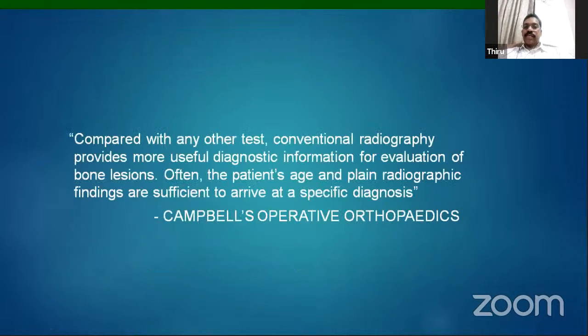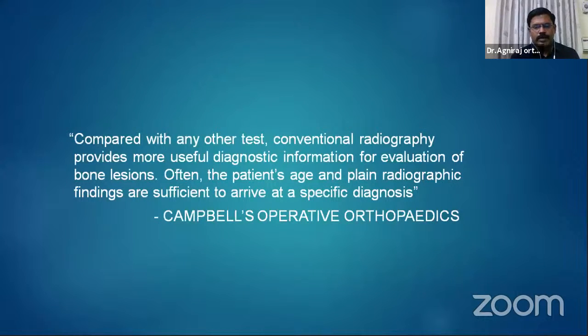These are the lines taken from Campbell's Operative Orthopaedics. Compared with any other test, conventional radiography provides more useful diagnostic information for evaluation of bone lesions. Often, the patient's age and plain radiographic findings are sufficient to arrive at a specific diagnosis. Though today's topic is radiology of bone tumors, I will be discussing only the X-ray, how to read a bone tumor X-ray, because as a postgraduate, X-ray is very important for you. For your level, you should be able to read the X-ray in a systematic and stepwise manner and come to a diagnosis, or at least a differential diagnosis.